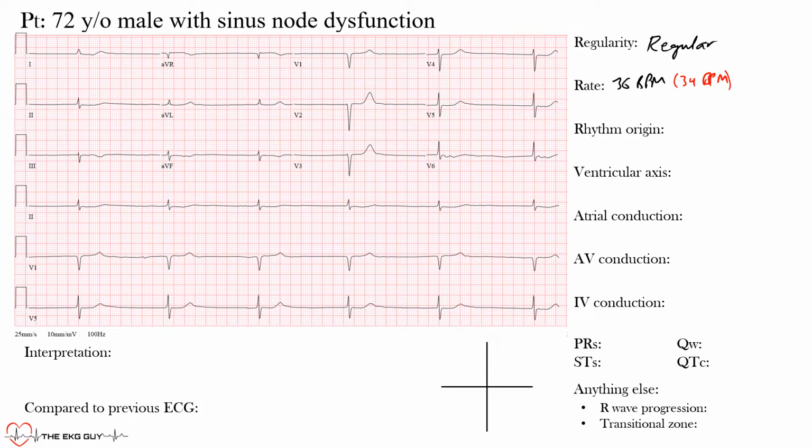So in this case, we have narrow QRS complexes, so then we look for P waves that are preceding these complexes, and as you can see here throughout, there are not any clear P waves, maybe some fibrillation, but no P waves in lead 2 or V1, which are the best leads that will show it. This you may think is a P wave, but if you look up, there's nothing there. So I would say there are no clear P waves here. So now we're dealing with a rhythm that has narrow QRS complexes, and it has no preceding P waves.